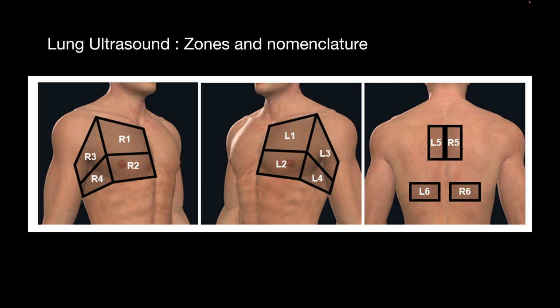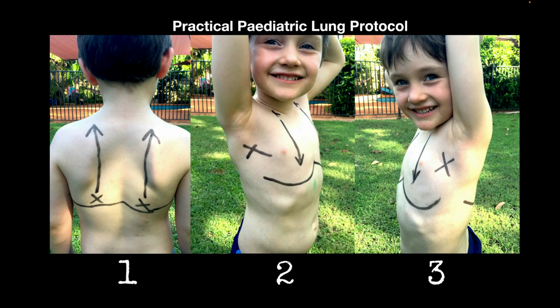Now obviously these are pretty large areas, but it just gives you a bit of an idea as to how we go about it, and also helps you with the idea of pattern recognition, because I'll come back to that again and again with lung ultrasound, is that this is all about pattern recognition.